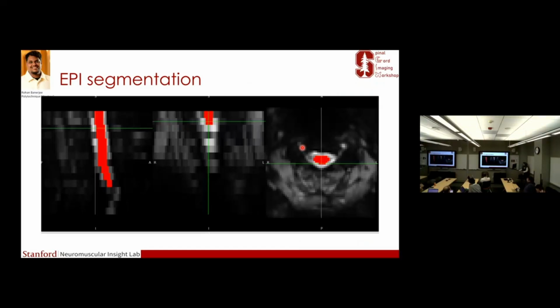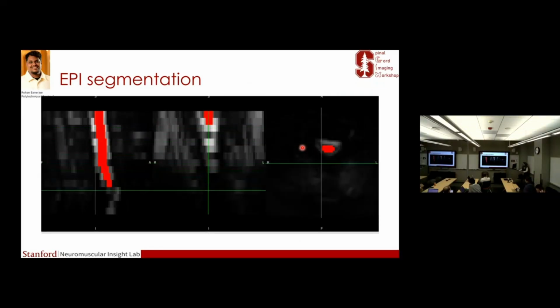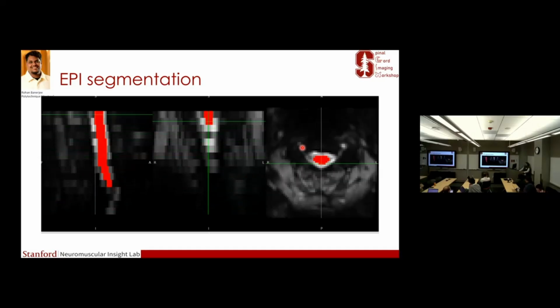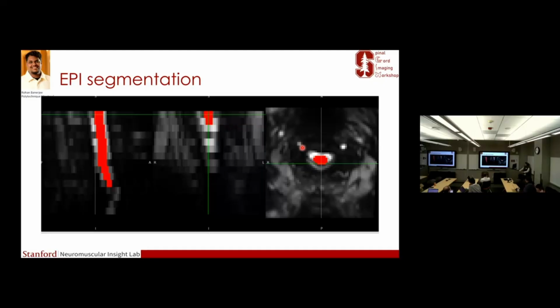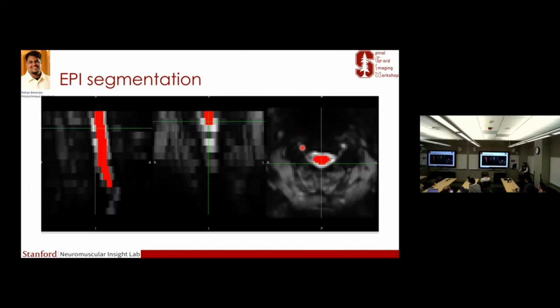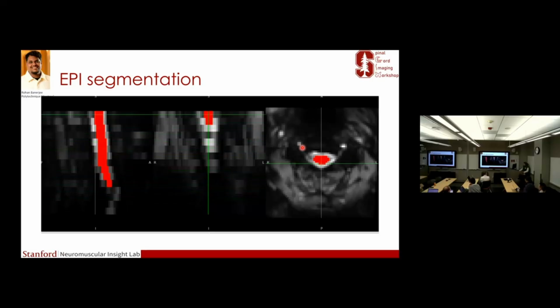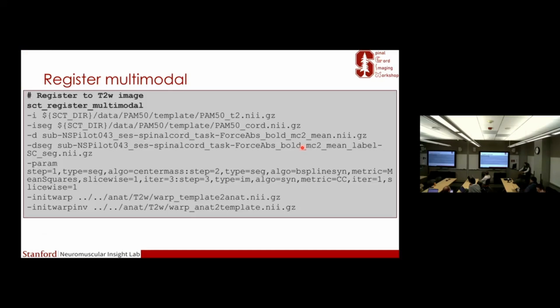And this is our segmentation for this subject. I might be biased, but this looks pretty good in my opinion. I wouldn't do manual correction on this. So let me show it to you again. Maybe small touches here and there, but I don't think it's really necessary. And always remember to check the outputs, even though the tools are getting more and more reliable.